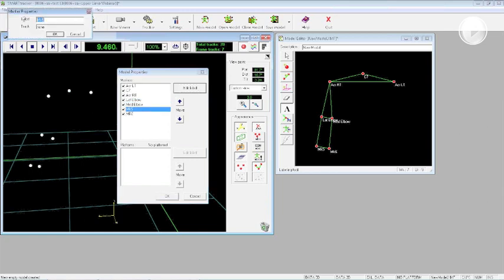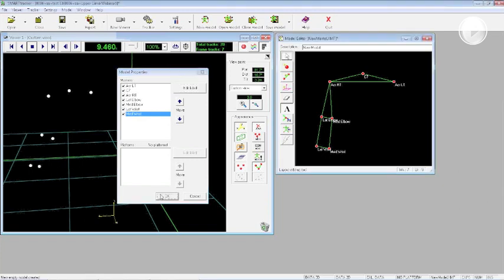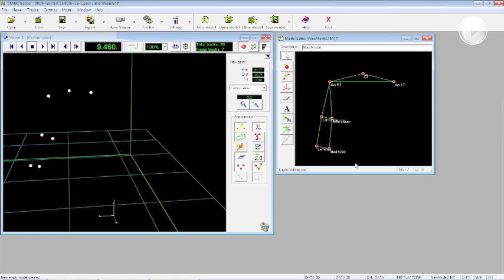And the 2 condyles of the wrist, the lateral one and the medial one. Of course, here we can type whatever name we want, but I suggest you to choose some labels that are also easy for you to understand in which point of the body are going to be placed. Once we have the model, we have to save it.